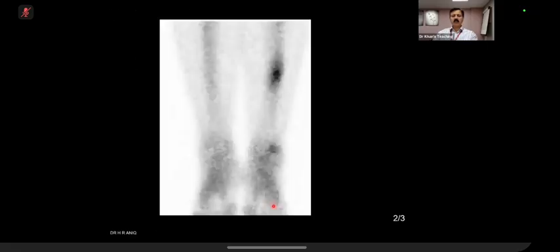In this particular case, initially a nuclear scan was done, and the nuclear scan is not helpful. And this is a key exam point. Don't ask for a nuclear scan, because a nuclear scan is a sensitive tool but not a specific tool, and it shows uptake, and we are where we were.